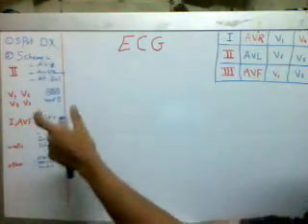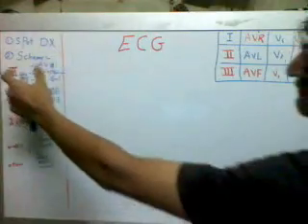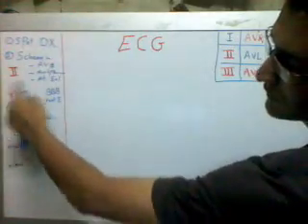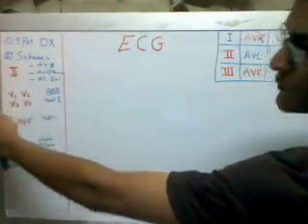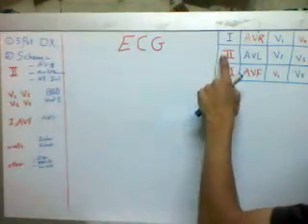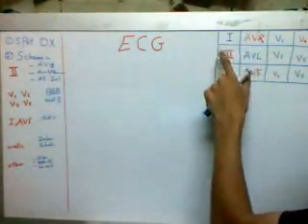This scheme needs to be repeated with regular repetition. You can't look for this before this. No, you have to make this number 1, this number 2, this number 3, as follows. First of all, we will look at lead 2. Lead 2 is the key of the ECG paper. Our key is lead 2.